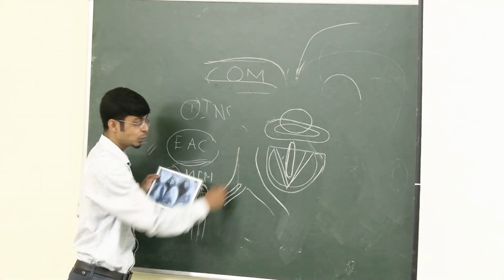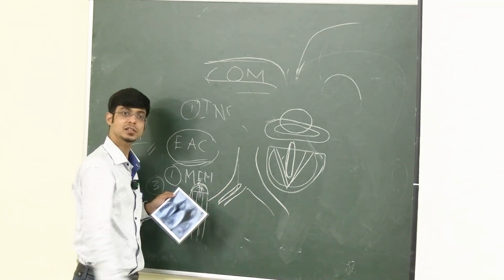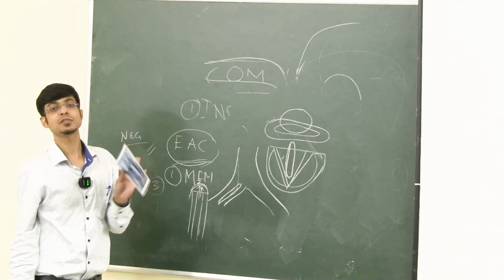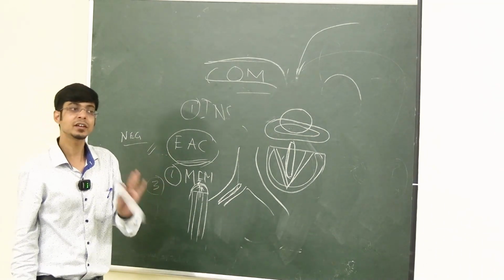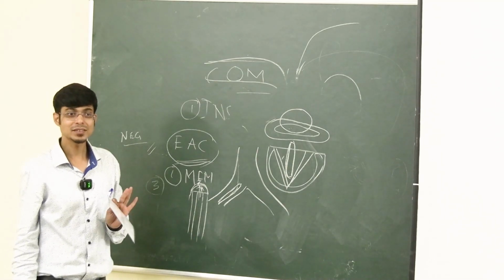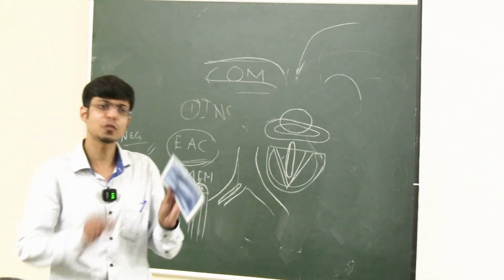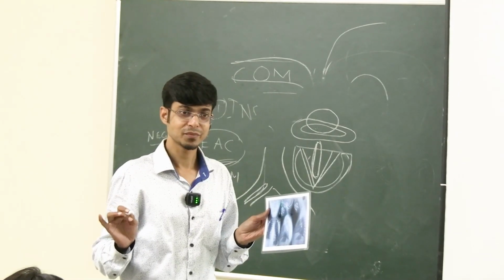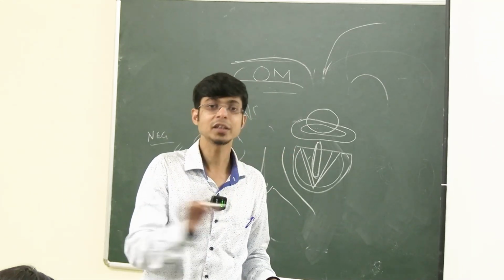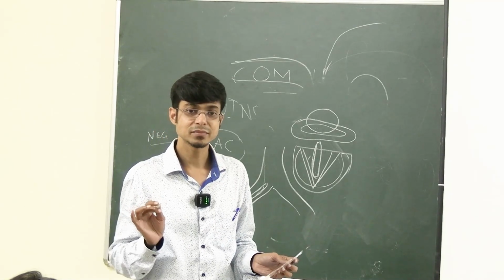Because esophagus এরকম ভাবে ঘুরে যায় না. A trachea is a straight structure. So it has to be the bronchus. Unless it has perforated and gone into the mediastinum. Esophageal foreign body going to the mediastinum after perforation, that's a rare entity. And we do not do X-rays for that, we do CT scans. Because the patient will come with severe chest pain, toxic patient, lot of things. So we'll go for a CT scan, we won't wait for an X-ray. Okay, but foreign body in the esophagus, perforating the esophagus, going to the mediastinum can look like anything. Because it can be anywhere in the mediastinum.